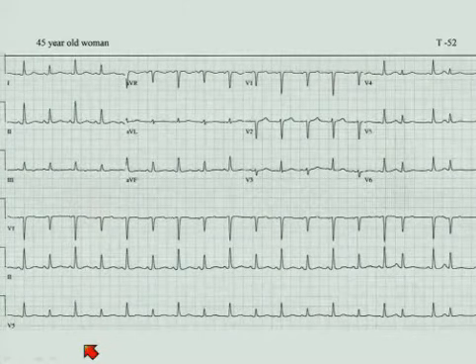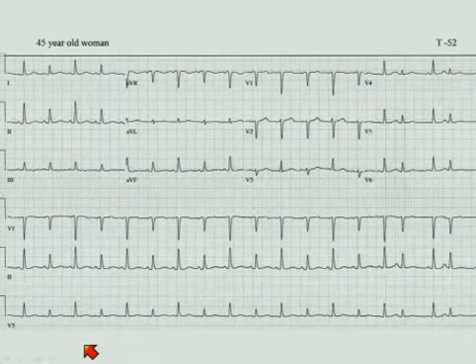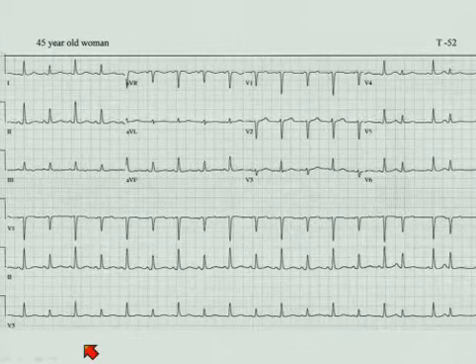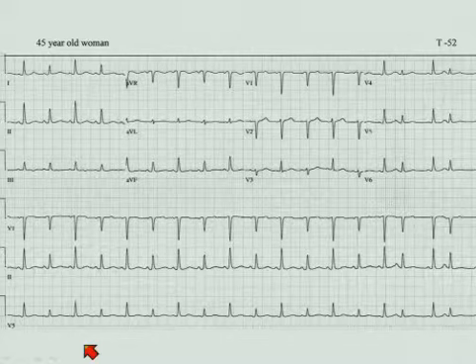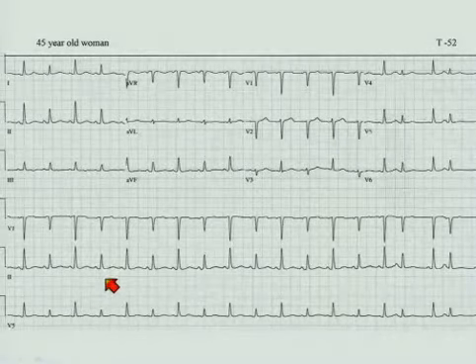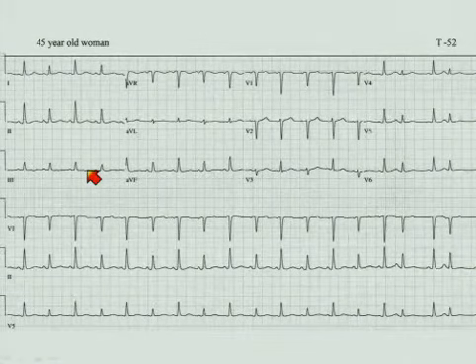Here is the true thing for pericardial effusion and electrical alternans. Electrical alternans is much more specific if there is total alternans, that is to say not just of the QRS but of the T and P wave as well. That's less common. Here it is, electrical alternans in a patient with large pericardial effusion.